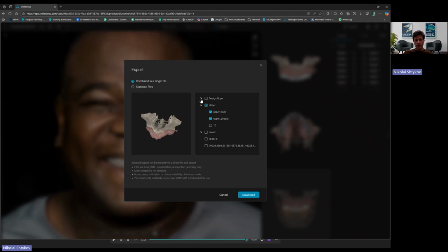You can download them, and then you can export also the design.